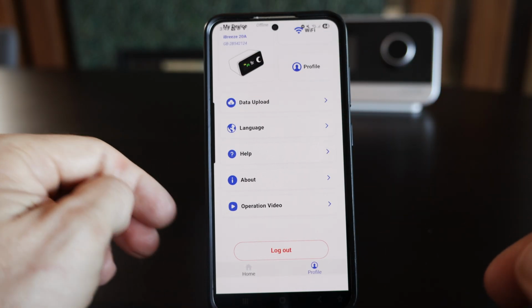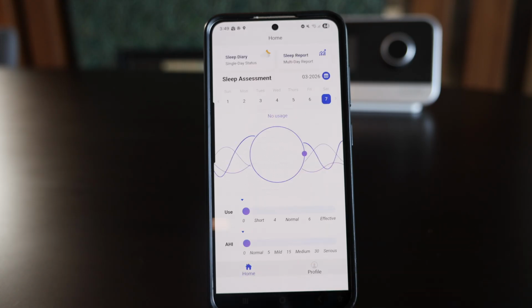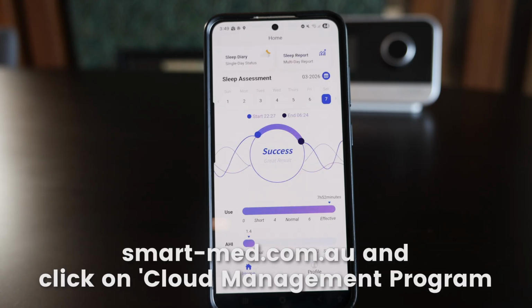So all in all, it's a great app, very comprehensive, and the best part is you can use your credentials that you log in with the app to also go and log into the ResAssist portal, which is where you have the full access to the clinical reports that you can also again download specifics and email yourself, and that you can access on a desktop.